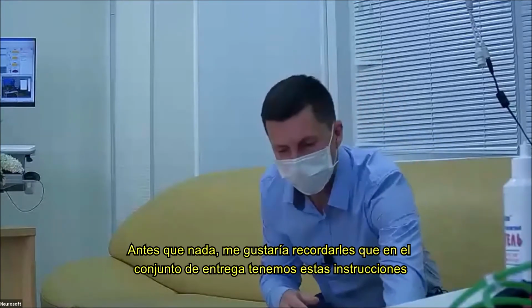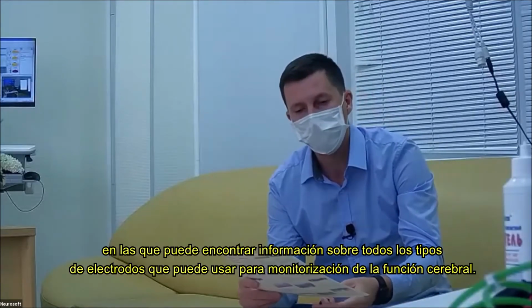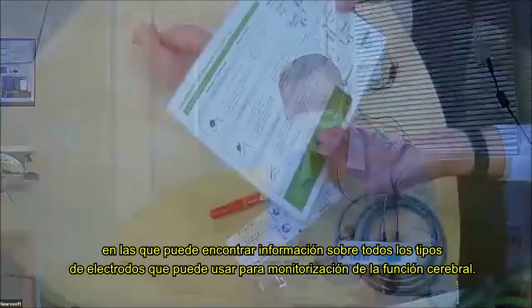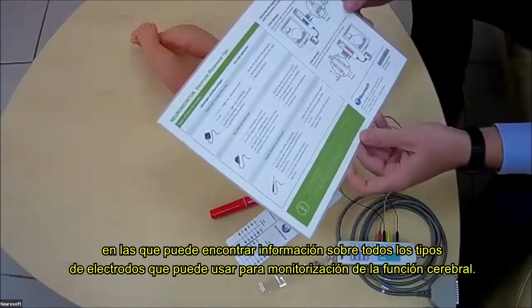First of all, I want to remind you that in the delivery set we have this instruction where you can find information about all electrode types which you can use for cerebral function monitoring.